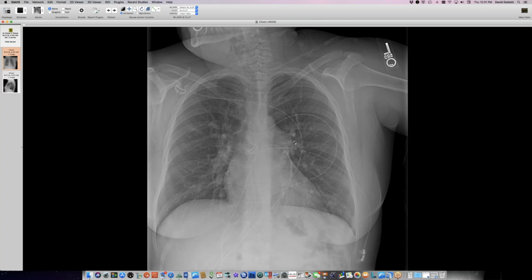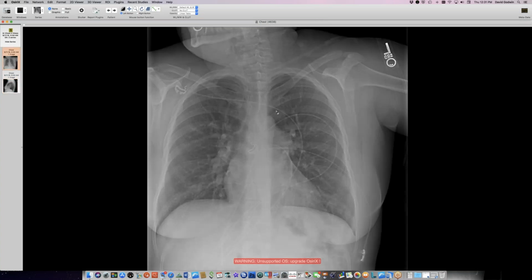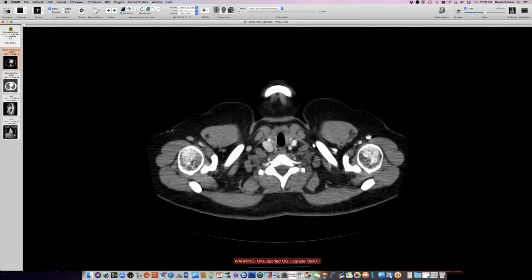Okay. There's a little rotation. I think the left pulmonary artery may be standing up because of this rotation. And I was trying to see if this person is truly standing. I think the person is truly standing. So, if this person were in bed, we could have this degree of vascular distension as a phenomenon. So I'm not sure about that. Okay, maybe false positive call.